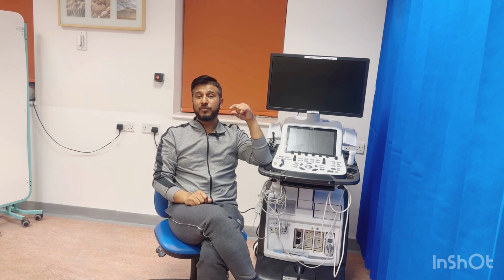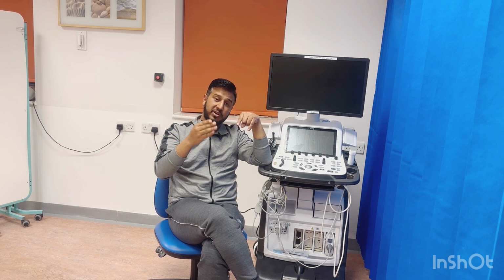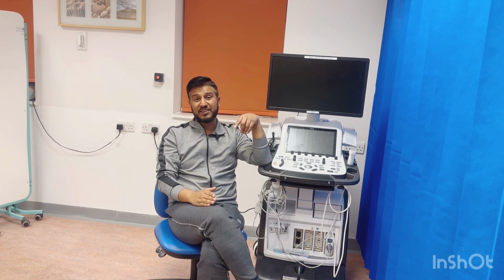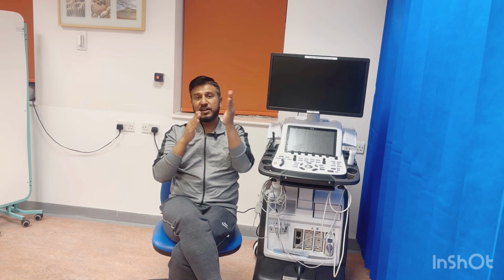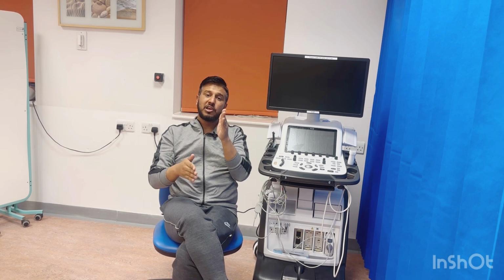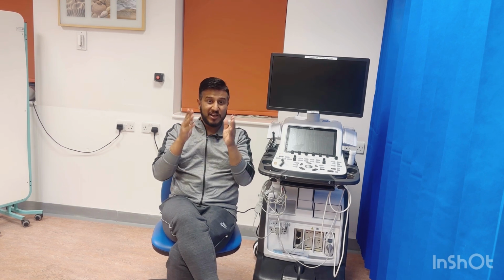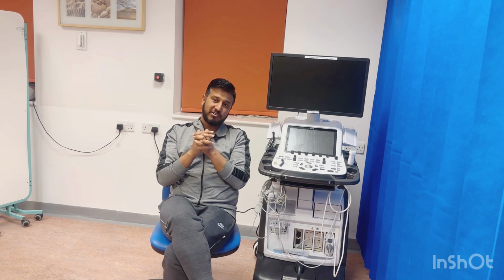Yes, with severe aortic regurgitation, the pressure half time will decrease, but it gives us an impression that the LV pressure has gone up, and now the LV and aorta pressures are equalizing very quickly. So that's what we get from the pressure half time.